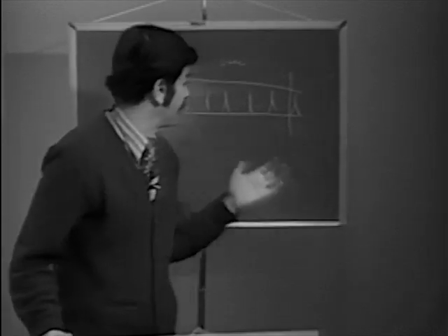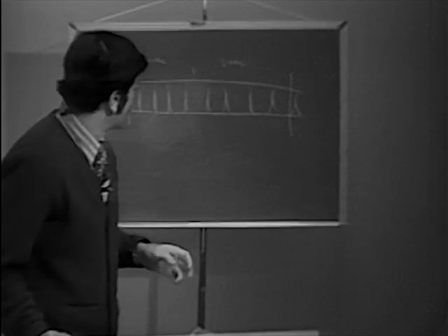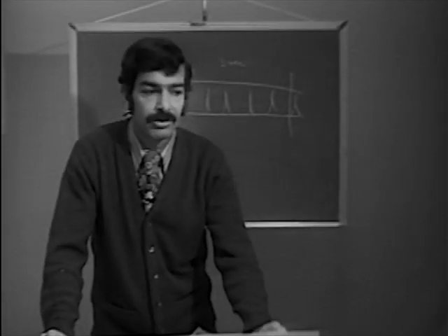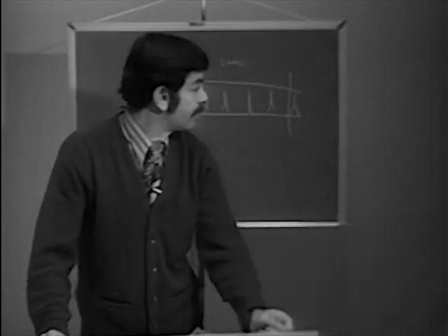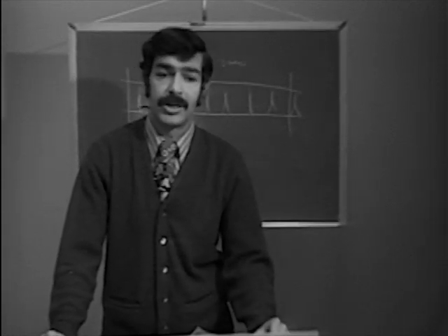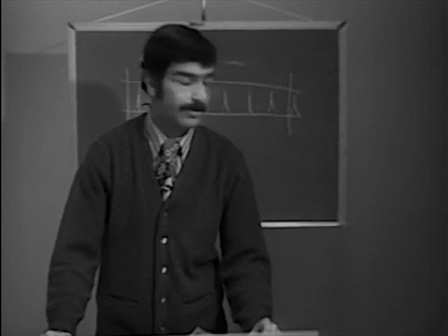Or, in other words, just multiply by 10, really. Okay, so that's probably the easiest and one of the most practical ways if you have a long enough strip. This is also very useful for determining heart rate in patients who have irregular rates.